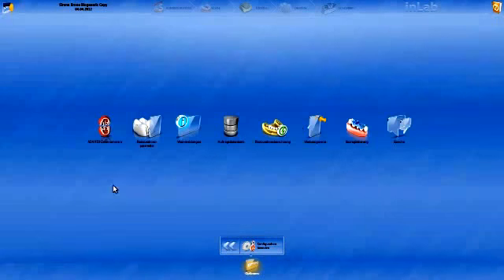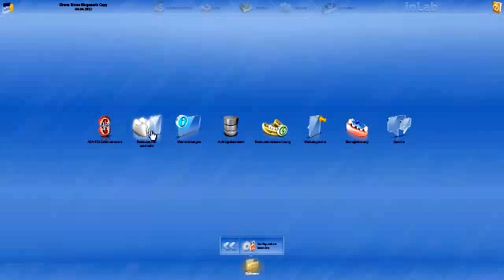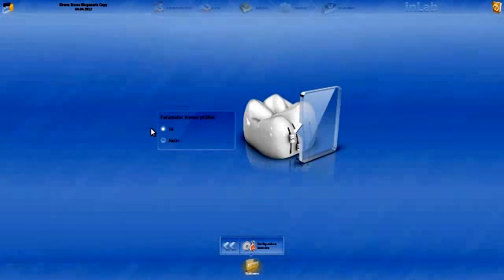Option: ADA and FDI tooth numbering. In order to specify the International or American odontogram, I then press the back button. The restoration parameters: if Yes is activated, the restoration parameters for every single restoration are repeatedly queried. If I no longer want this, I click on No.